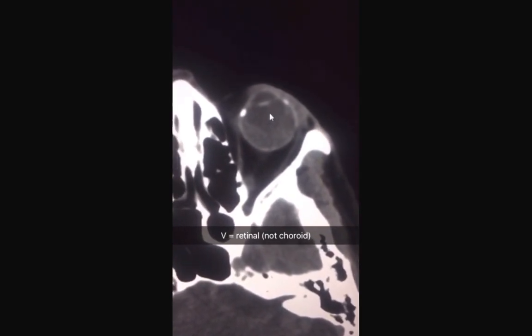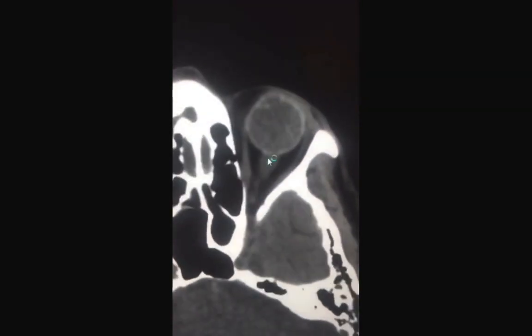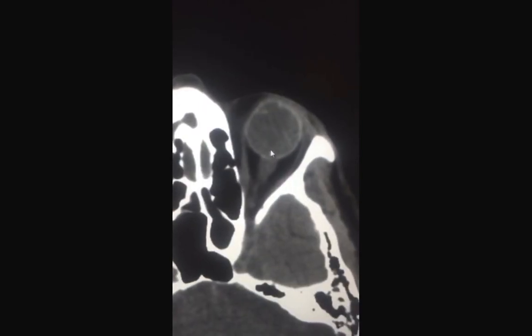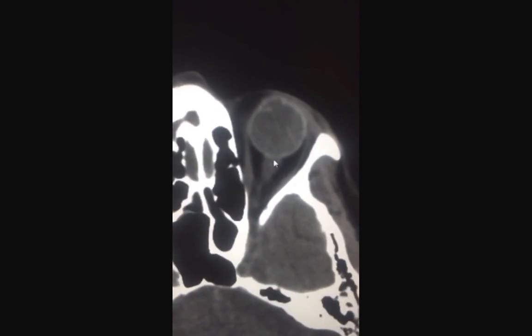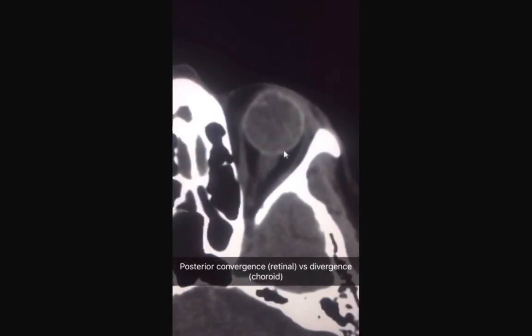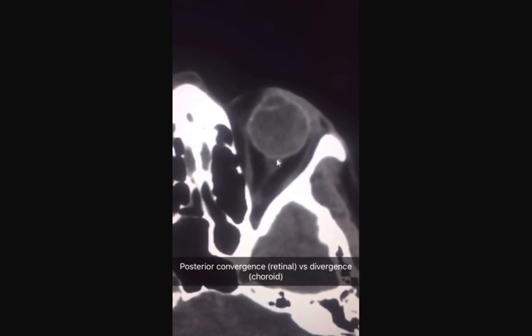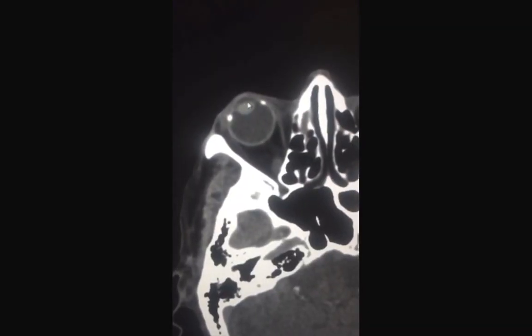Another difference is that the retina extends all the way to the insertion of the optic nerve, and that's why this abnormality is converging towards the optic nerve insertion. This is in comparison to detachment of the choroid, where the abnormality is away or divergent from the optic nerve insertion.